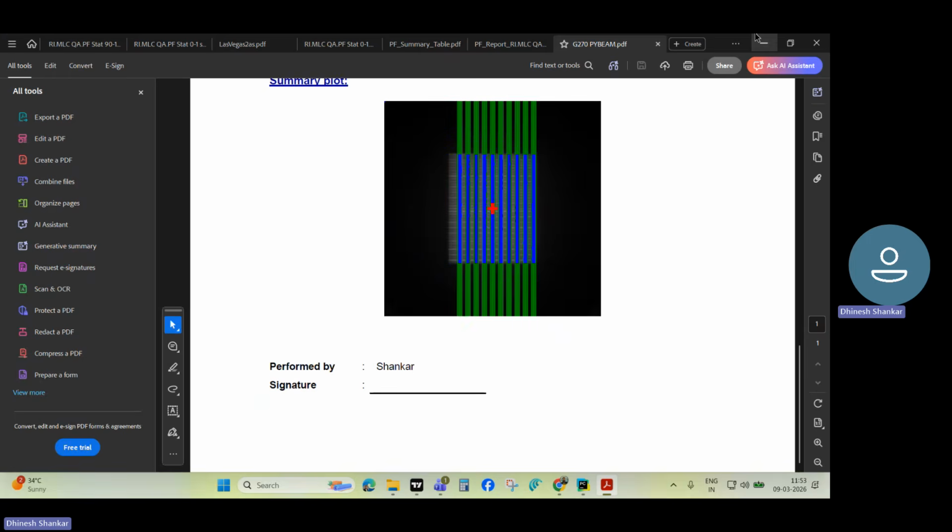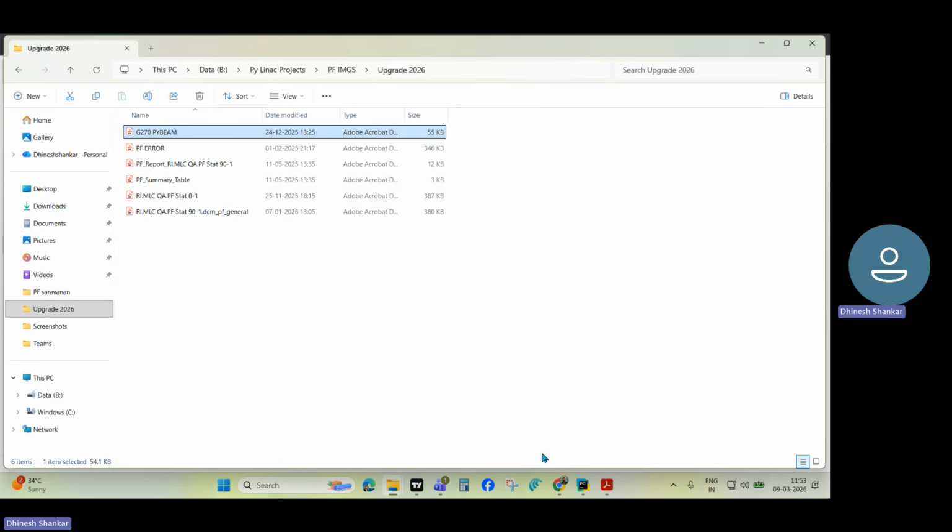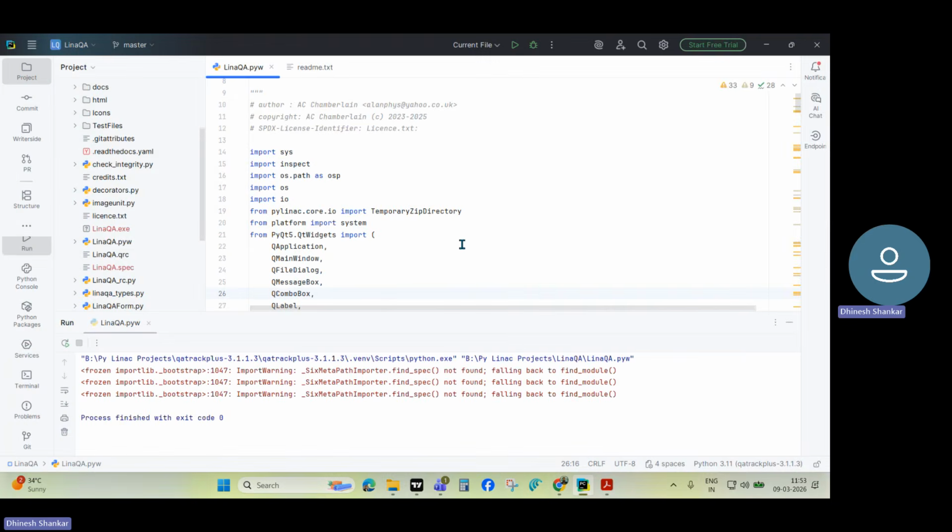Something like this. Okay, why we're discussing this customization part is that each and every time, opening this package information and this script, running this file and moving forward with the analysis will be quite difficult. If you make any small changes here, it will give so many errors. So for that, we have to convert this particular package into a simple executable format, an exe file.